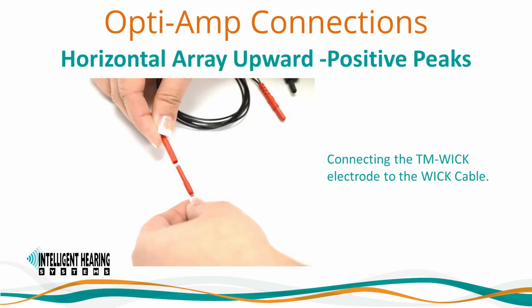Let's review the Opti-Amp connections for a right ear single-channel eCoG using a horizontal array. This will result in an upward positive displayed SP/AP response. We will cover the Duet patient cable connection shortly. Connect the TM-Wick electrode to the Wick cable.